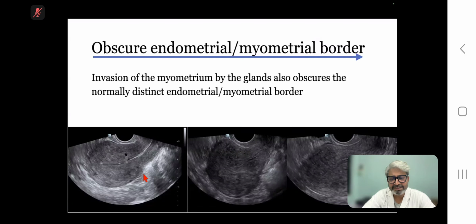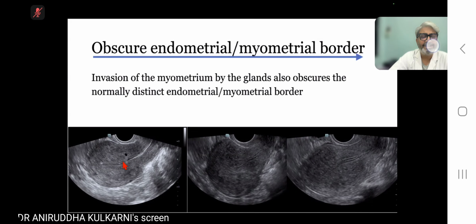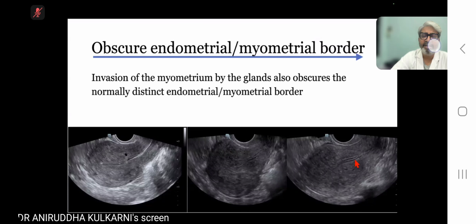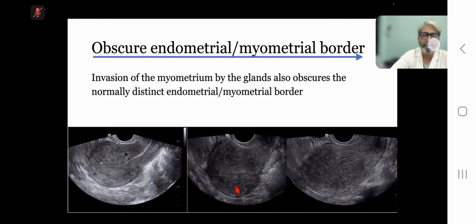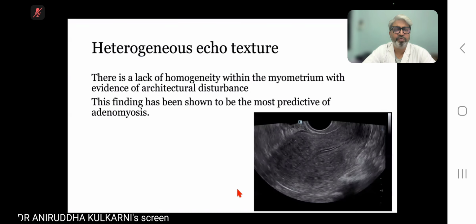Now, in all these three static images, you can see that I can make out the endometrial outline as a midline structure, but the triple line configuration is missing in all three. It can be seen in the lower part of the cavity in image 3. At the same time, the endomyometrial junction zone is quite indistinct, and it is occupied by multiple hypoechoic and hyperechoic infiltrates in the adjoining anterior and posterior wall.